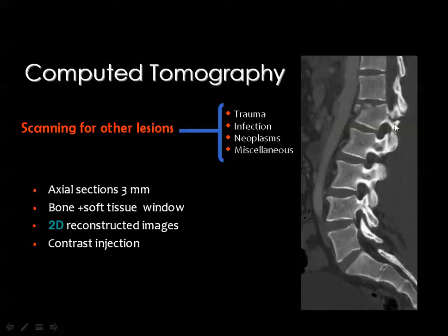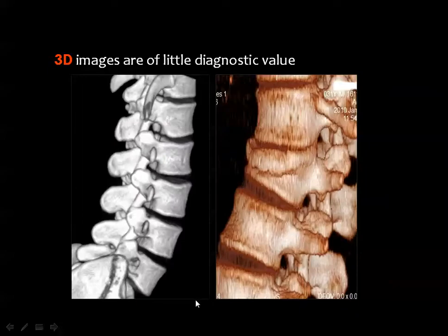And here you see this is a fracture at the level of L1 vertebral body with depression of the superior end plate, and the fracture is extending into the pedicle and the neural elements. I will discuss this in detail in the lecture of spinal trauma. Also, you may be able to have the 3D images of the scanned segment of the spine, whether in color or without color.